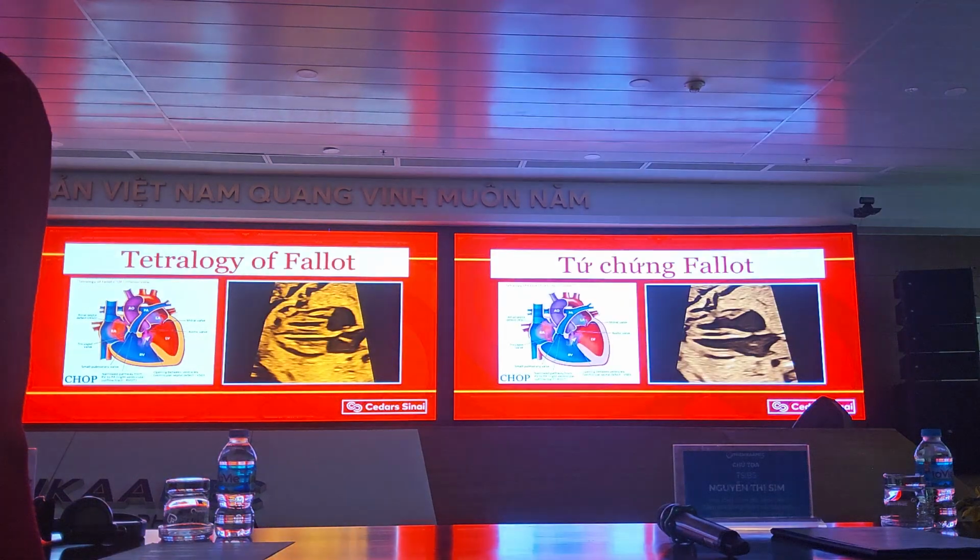So that's pulmonary stenosis, which is quite important as it's a very common abnormality. Those of you who scan, which I think all of you do, know that the pulmonary valve is often the hardest valve to see. Sometimes it's just hidden, the baby's head is extended at the neck, the chin is on the chest, and it's very hard to see the pulmonary valve. It's sometimes very easy to see the other valves, but the pulmonary valve can be very hard, and it's important not to overlook it.